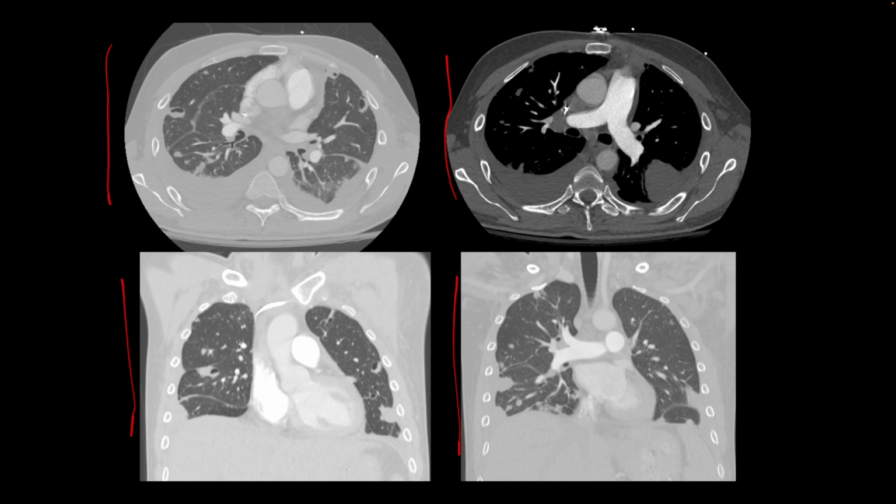And so let's start here on the axial image. There are multiple bilateral peripheral nodular densities with cavitation. And there are effusions on both sides, right worse than left. And then we see the same finding here on the coronal images. There are wedge-shaped peripheral densities, and some of them are cavitary. And so these findings are classic for septic embolism, where there are wedge-shaped pleural-based densities which become nodular and develop cavitation. And also these patients will have reactive pleural effusions.